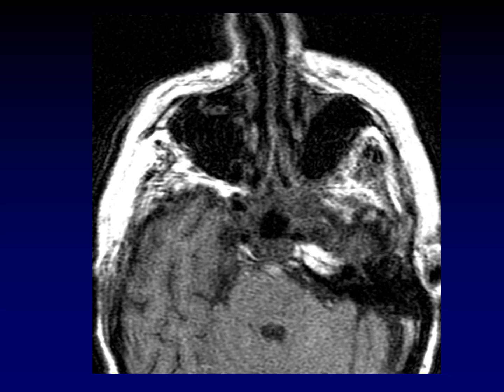Even in patients who have terrible scans. This is an example of somebody with a lot of motion artifact. We couldn't even get to the post-contrast sequences. They said, is there any perineural spread in this patient? It's going to be tough with this quality of imaging. But look, here is the normal fat in the pterygopalatine fossa, and it is obliterated on this side. Yeah, there's perineural spread here. This tumor has completely filled the pterygopalatine fossa, and we can make that distinction even on images of this quality.